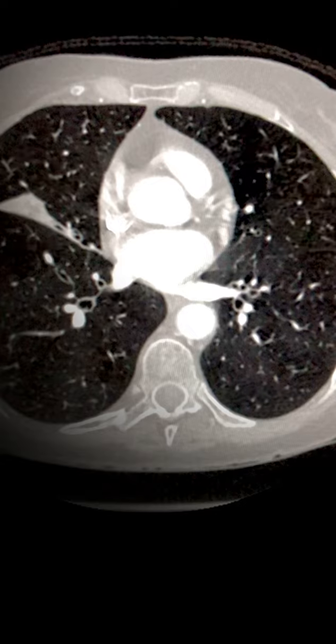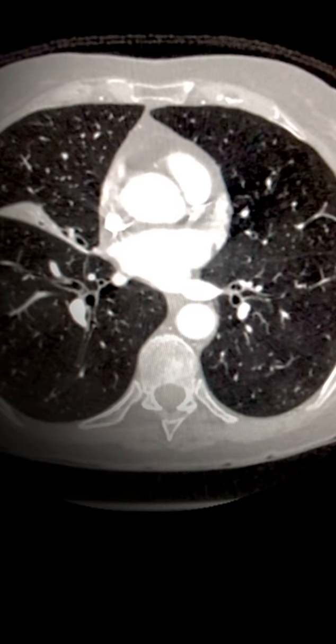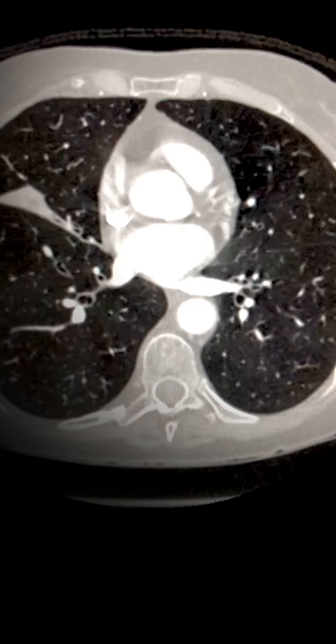If you look on a lateral projection, there's a greater than expected linear density in this direction. Now we're going to look at a CT scan of the same patient to see and evaluate how the middle lobe collapses. In this particular case, the way the middle lobe has collapsed is more towards the periphery of the lung, and that is due to the orientation of the other two lobes.